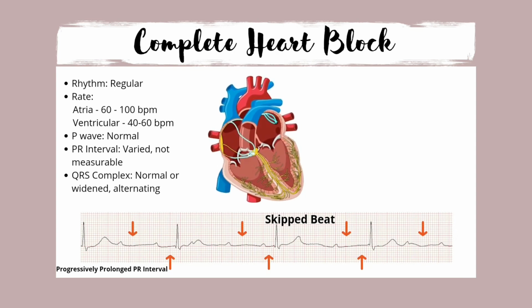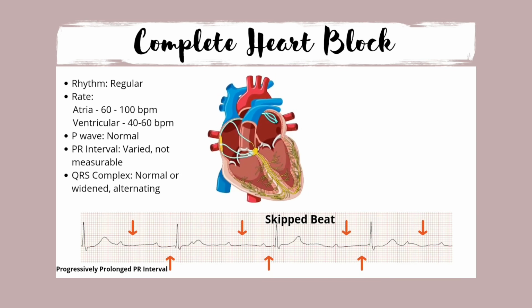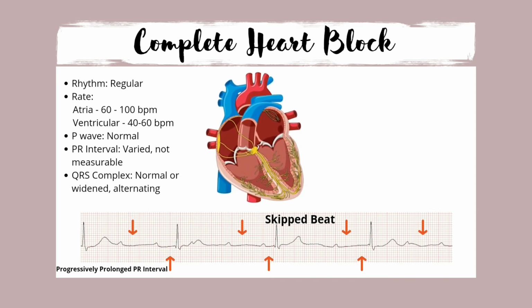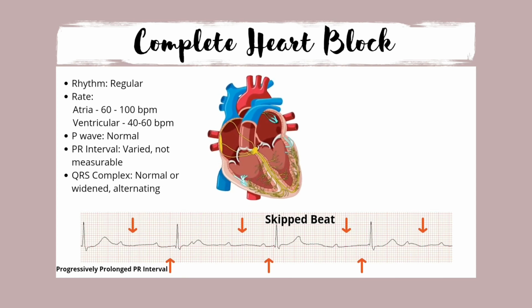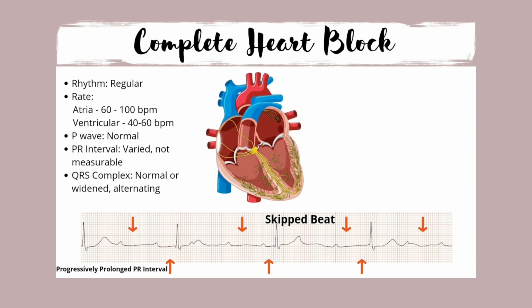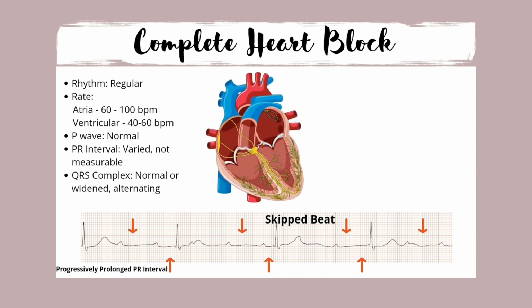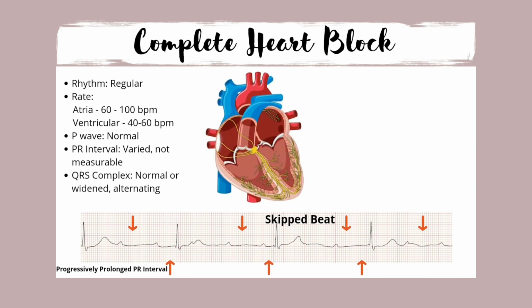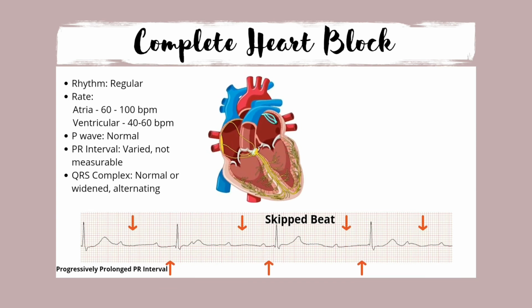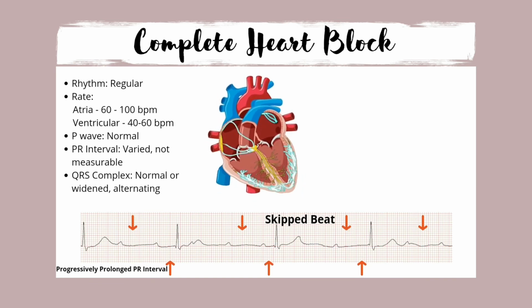Complete heart block. Complete heart block, or third-degree atrioventricular block, AV block, is a medical condition in which the nerve impulse generated in the sinoatrial node, SA node, in the atrium of the heart cannot propagate to the ventricles. Because the impulse is blocked, an accessory pacemaker in the lower chambers will typically activate the ventricles. This is known as an escape rhythm. Since this accessory pacemaker also activates independently of the impulse generated at the SA node, two independent rhythms can be noted on the electrocardiogram, ECG.